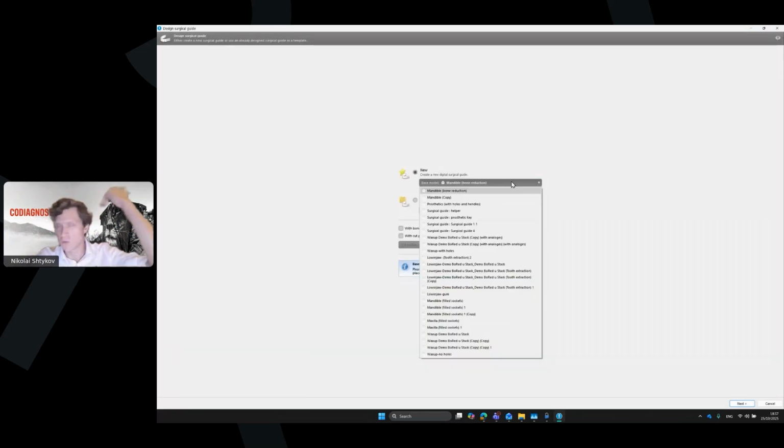When you work with such complex cases, when you upload a lot of STL files in coDiagnostiX, you can do this. You can upload a lot of files here, and this is a very nice benefit we have in coDiagnostiX. But sometimes you have a mess when you have a lot of files there.